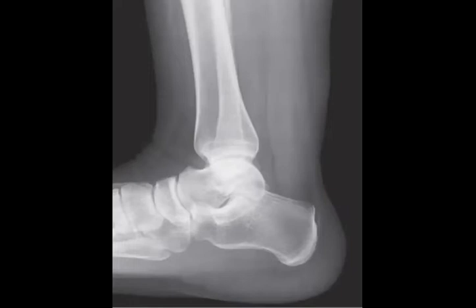The patient has painless swelling, so he doesn't have any pain. So do you see any abnormality that makes you think about something? Are you happy with this appearance here? Do you always see soft tissue like this here? What is your differential?